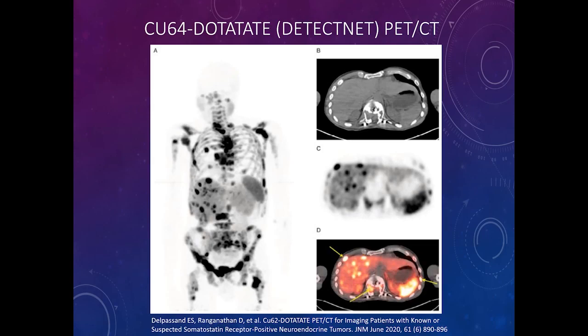In this case, kidneys are not that hot, but you still see on the cross-sectional images that kidneys do have uptake. It's just not that obvious on the MIP on the left because of the patient having this widely metastatic disease in the bones. So it's quite similar.